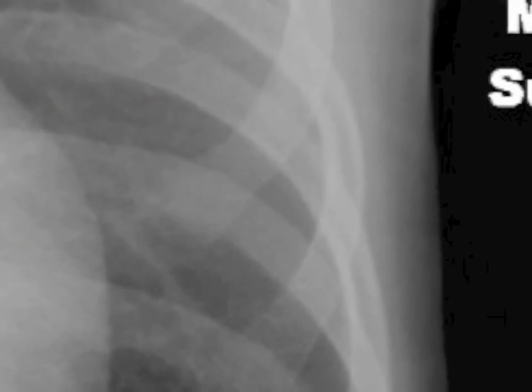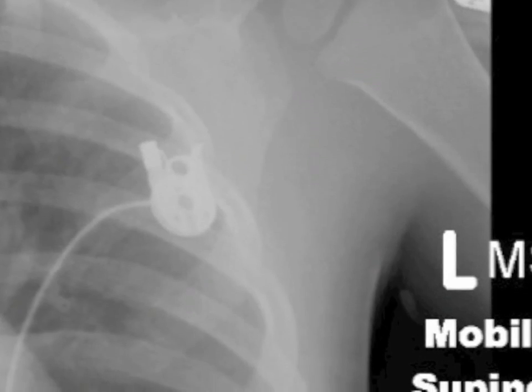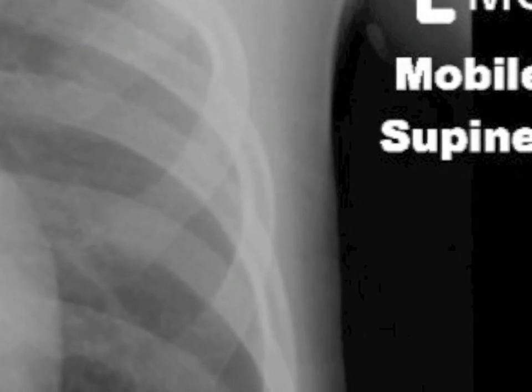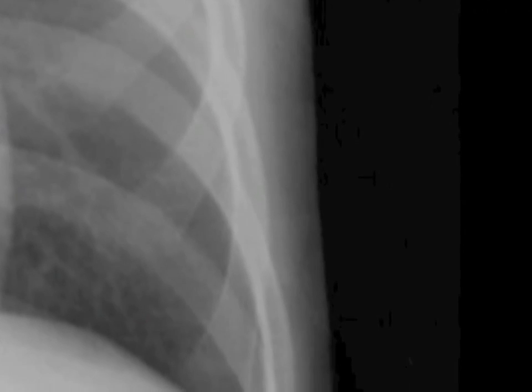Typically the lungs look dark grey due to the small septae and blood vessels within the lung tissue. Compare one side with the other, one rib space at a time, to detect areas of difference. Look for areas where the lungs are both too light and too dark. Finally, carefully examine the pleural spaces. Look for a pneumothorax on the film. Also check for pleural fluid in the costophrenic angles or encroaching around the outside of the lung laterally.